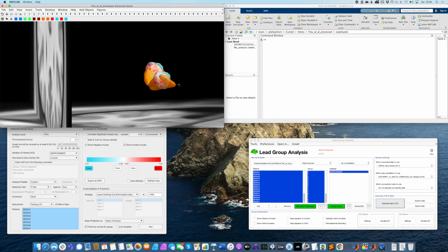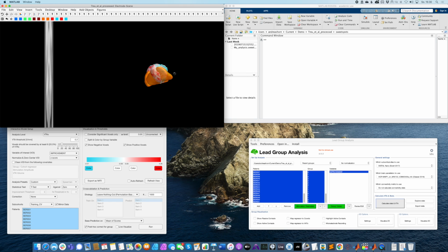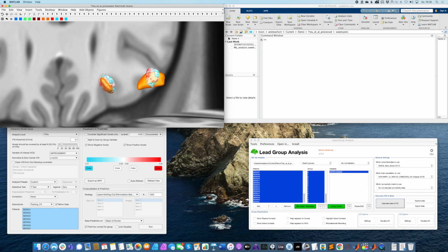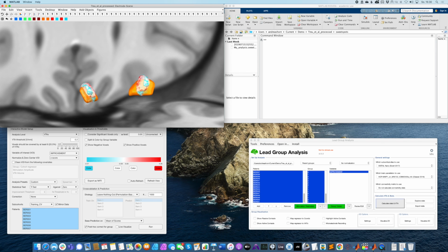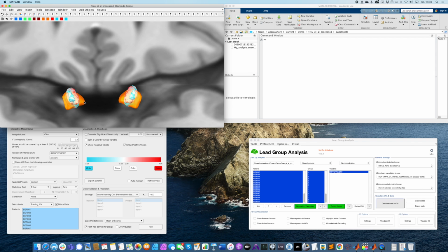They are not 100% symmetric because we use an asymmetric template of the MNI space, and so the VTAs indeed get flipped non-linearly from left to right, so you might see very slight differences across the two sides, but as you can see, we're now looking from posterior.